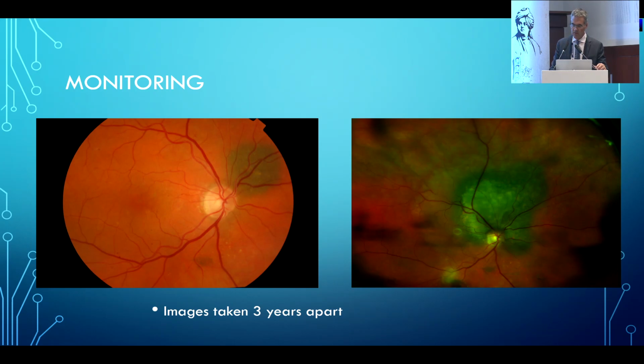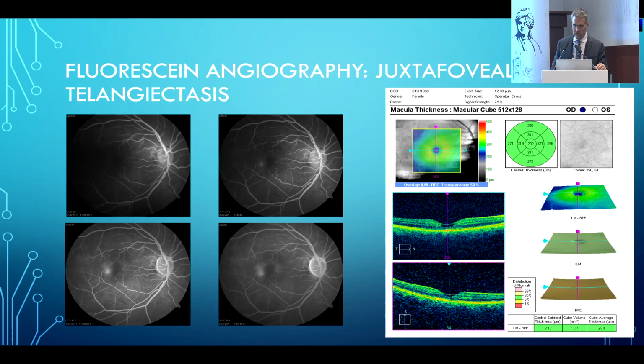Photography can sometimes even make the diagnosis, such as in this case of uveal melanoma. And of course there's also fluorescein angiography, which I'm sure everyone knows about.